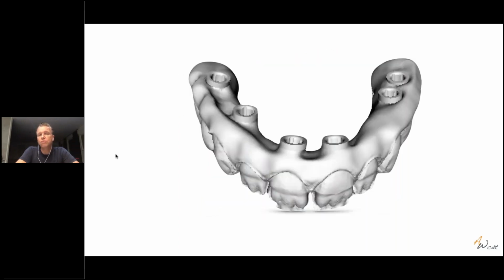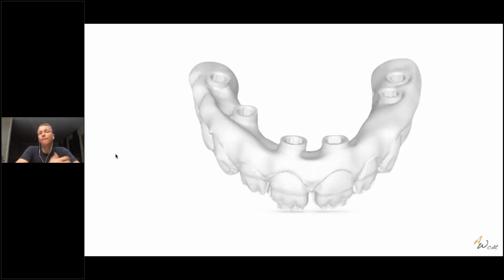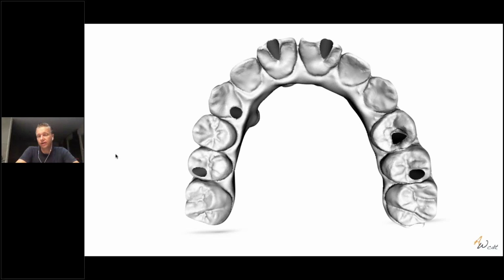Nowadays, I utilize for most of this restoration the GenX material, which is a multi-layered high-strength zirconia that allows me to actually make the cutback even more minimal, just because I already have a beautiful color support from my restorative material, and I just have to take care of the gingiva, the pink area basically, because I usually don't even color this anymore. I don't even color the gingival area in pink with the Ceramill liquids. I actually just layer pink porcelain, and that comes out very nice.